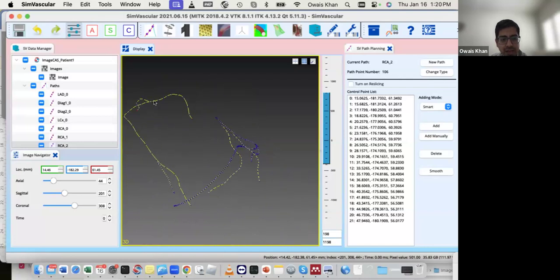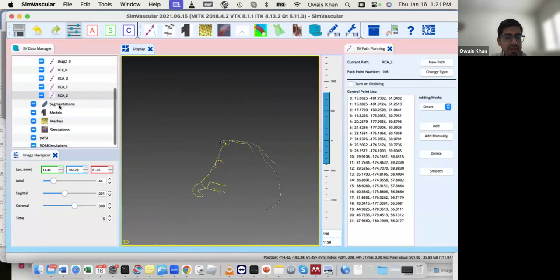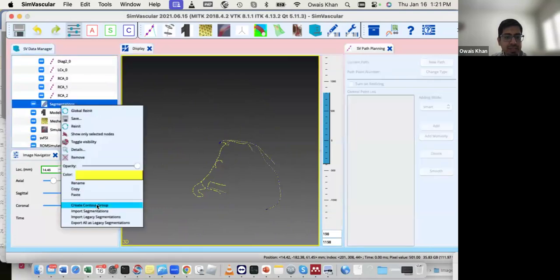On the right-hand side, we have the main right coronary artery that's coming out, and then it branches into a PDA and PLA. And then you have an AV branch, and there might be some other smaller branches that you could segment, but this is probably the main structure that you wanna segment out. So let's see if we can start building up our segmentations.